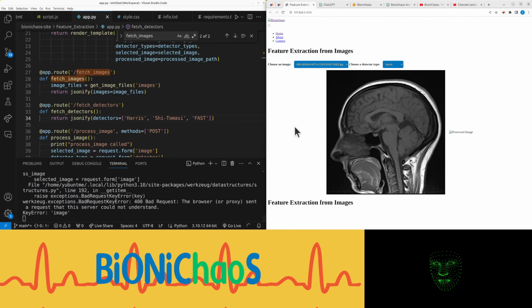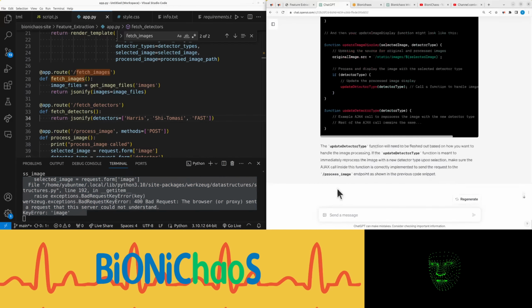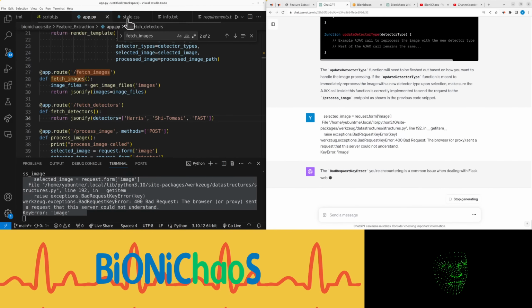We're having this error. Let's pop this error in quickly.